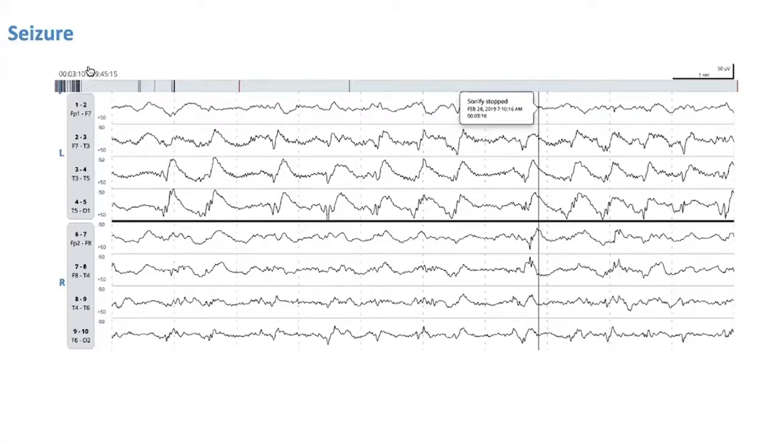Would you agree? Yeah, to that point, you bring us to a really important clinical pearl, which is when you see something on EEG at only one electrode, be very suspicious that it's artifact or noise, because cerebral electrical activity should not appear at only one electrode. Right. There are exceptions, but that's a good place to start when you see that.